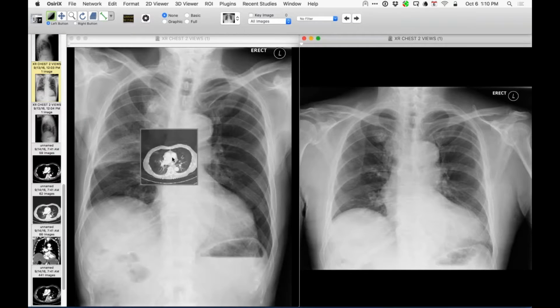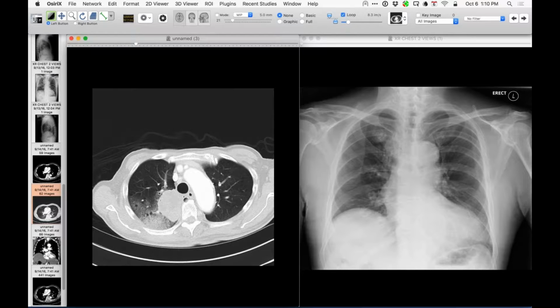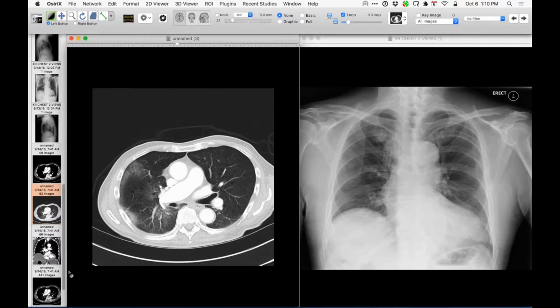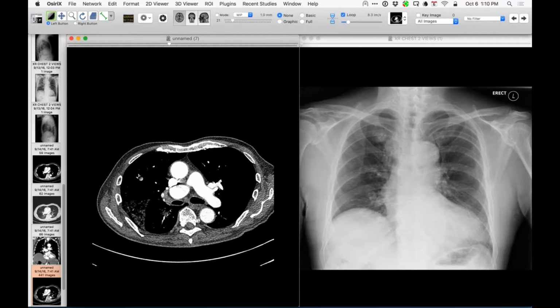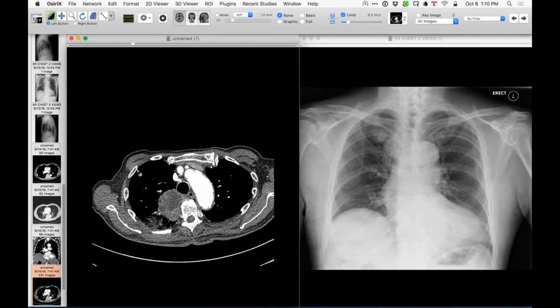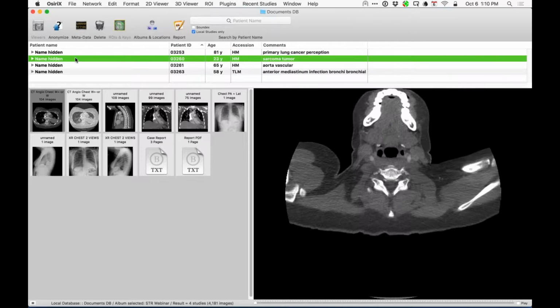Here is the CT now, and you can see that it is quite large, but where it's located, and there's hemorrhage there, it's just another lesion in the category of hard to see lesions. All right, let me go on to show this one.